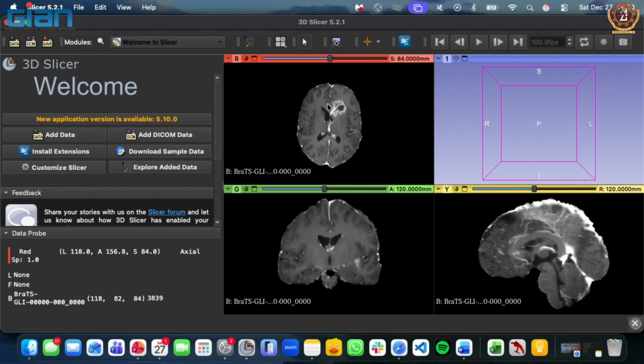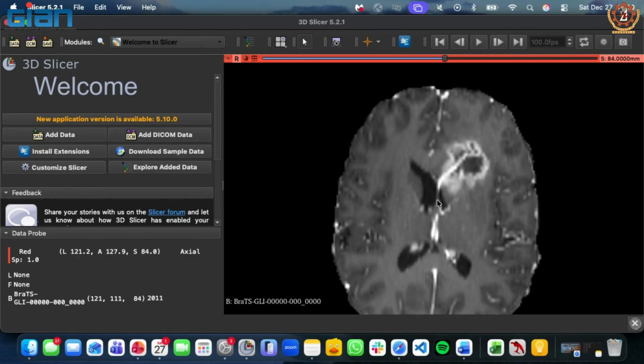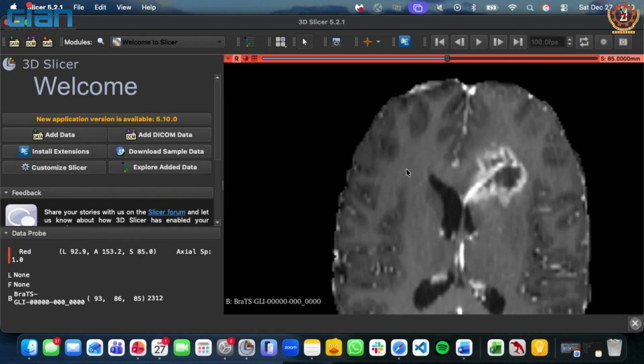Now I was talking about brain mask segmentation. Brain segmentation is fine, but let's say you want to segment the different anatomies of the brain. For example, you have the cortical gray matter, basically these black regions, and then there is white matter, and then these black hole-like things are lateral ventricles, etc.